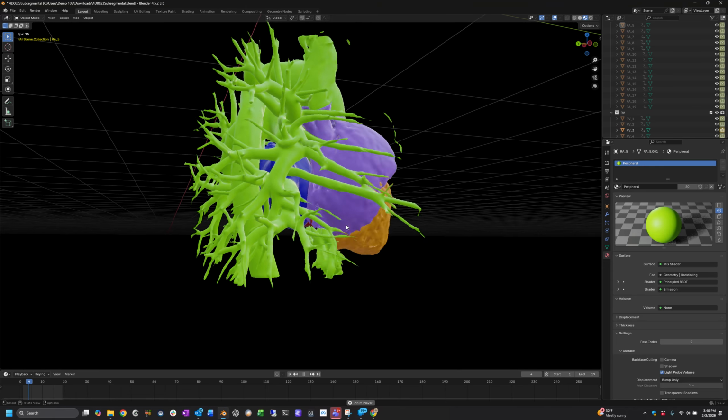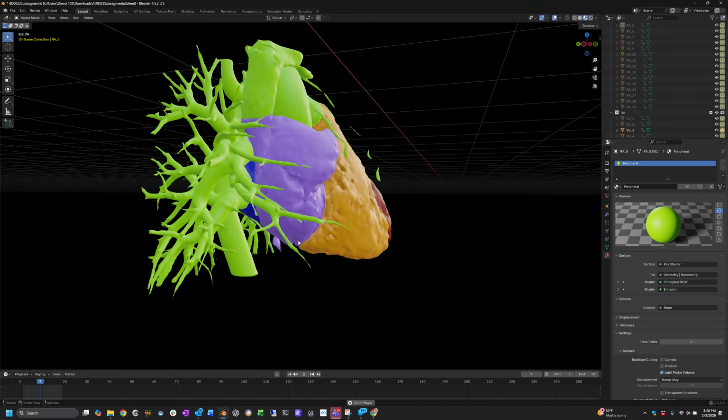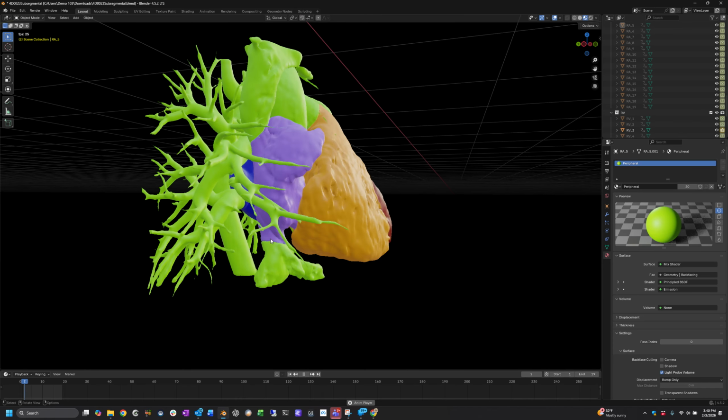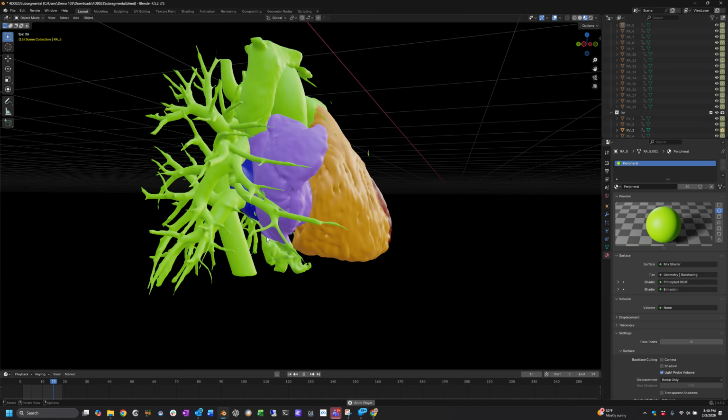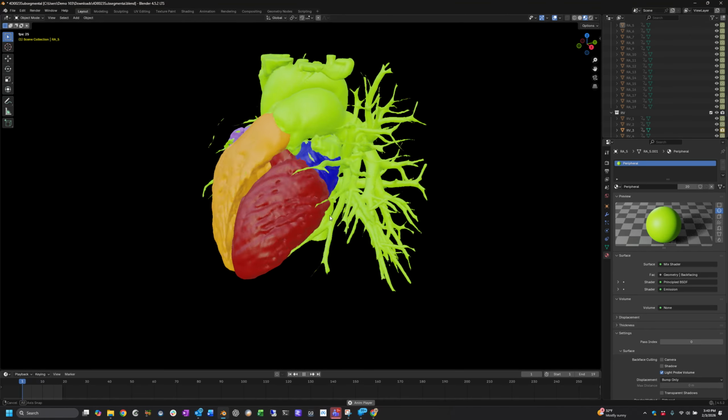And if we apply that, I think the IVC is in a good spot. I think this is a good location. It's fairly consistent. The only thing different is whether or not there's contrast parked down in there.